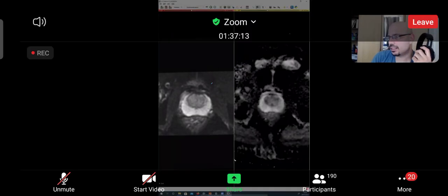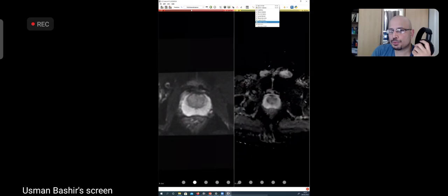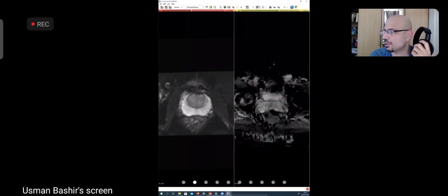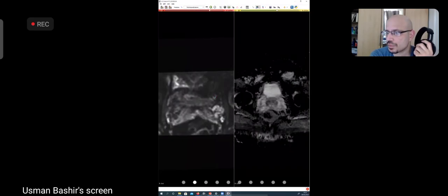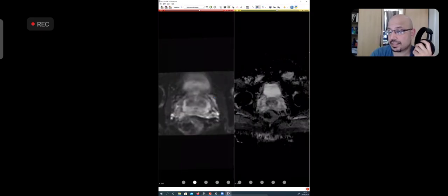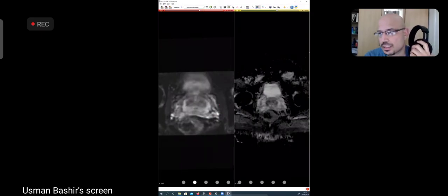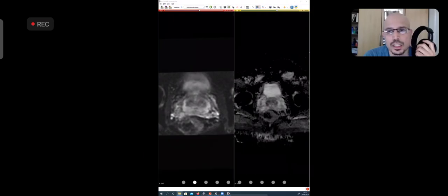But unfortunately, with what I can tell, and hopefully you will still get it. So, इसका bladder इतना full नहीं है, and bladder is a very good reference when I have another case. Let me switch to another case. उसके ऊपर मैं आपको थोड़ा सा, and that'll be the last case of the day. उसमें मैं आपको central transitional zone cancer एक दिखा दूंगा, और hopefully उसका bladder भी थोड़ा सा full होगा, तो हम उस पर diffusion भी discuss कर लेंगे.